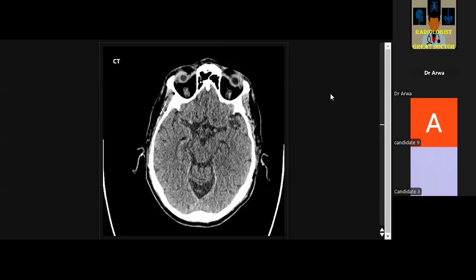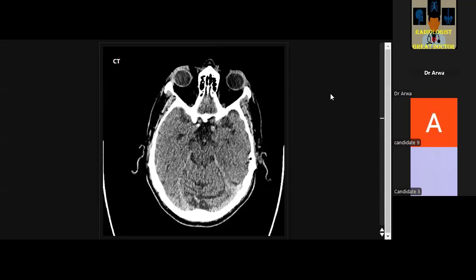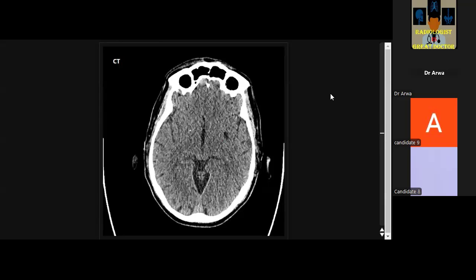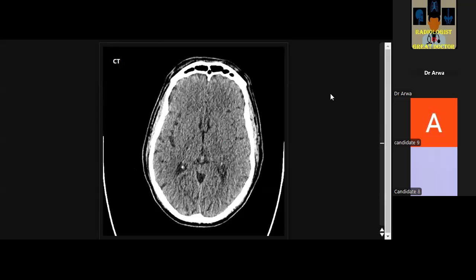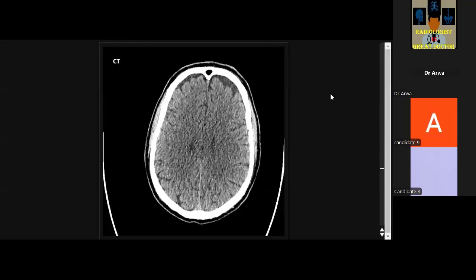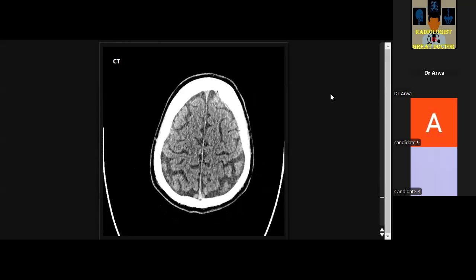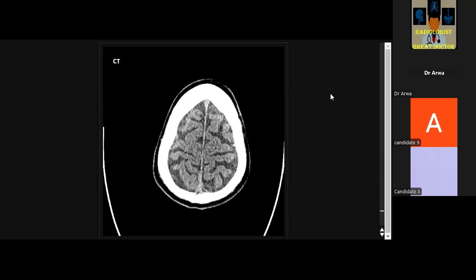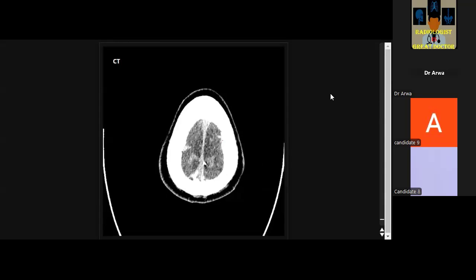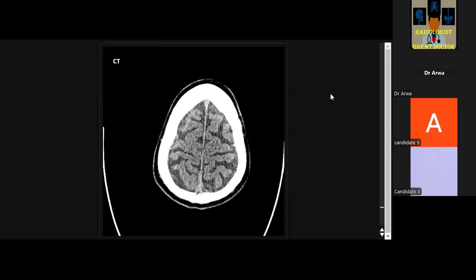Any finding here? I'm scrolling through the images. I'll do a quick scroll and then I'll talk about my findings. Scroll till the end, till the last cut, then come. So in the real exam, please stay calm. There was no obvious finding on the first scroll. Good. So now I would look at my review areas.